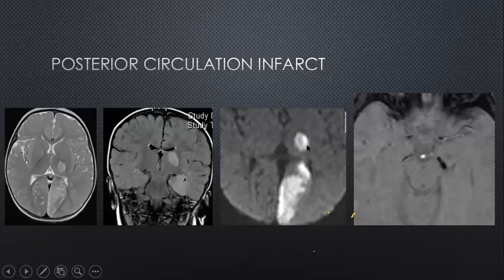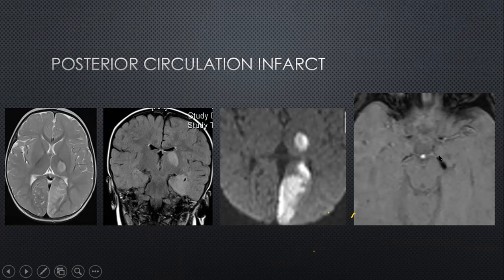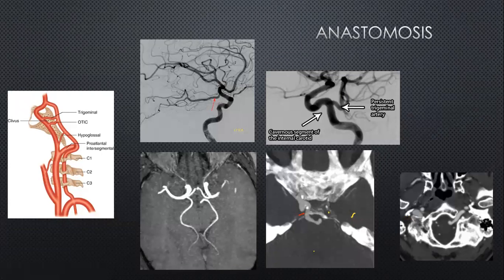This is an MR scan, and this is to show you an SWI image with the thrombosis which is occurring within the left PCA, which has resulted in infarction of these territories. And just the final two slides. I know we are about 20 minutes already beyond.